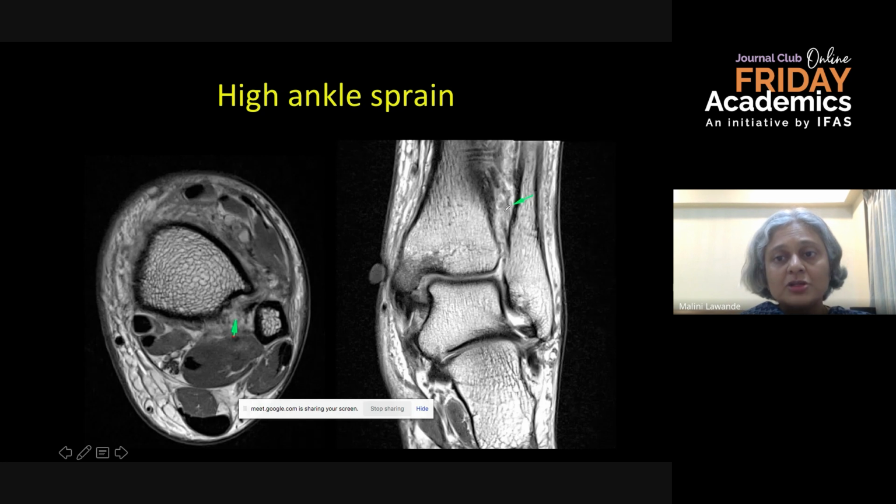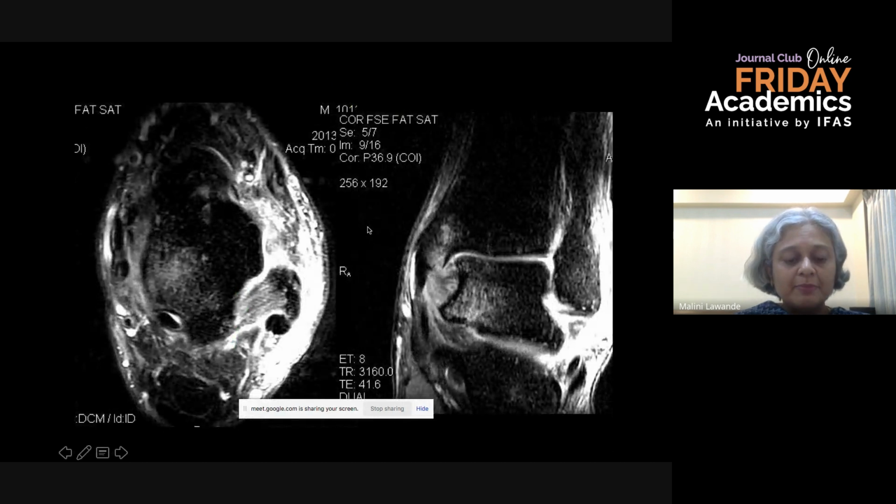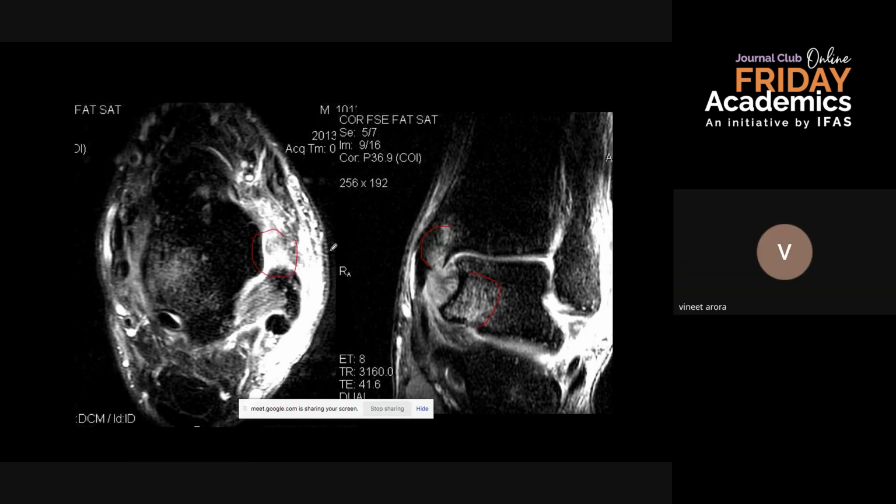The same patient also had syndesmotic ligament injury. You can see there is disruption of the fibers towards the tibial attachment. MR can also play a very important role to look for occult fractures like anterior calcaneal process, lateral talar process, sometimes non-displaced fifth metatarsal or cuboid fractures, which may be missed on radiograph. MR will also show you these marrow contusions, marrow edema, so significant marrow edema, and there is an ATFL injury.